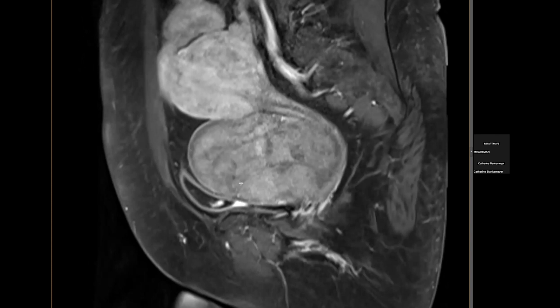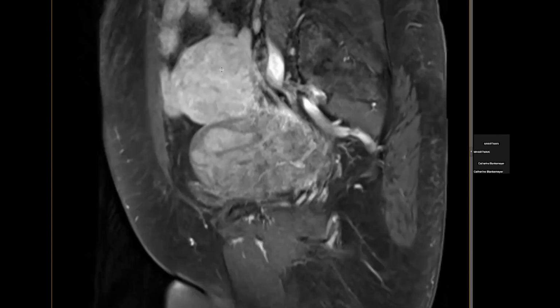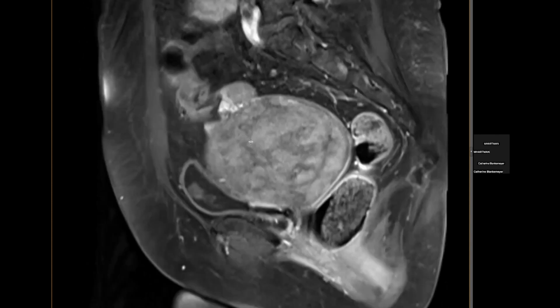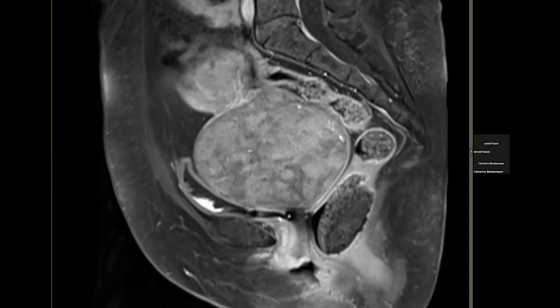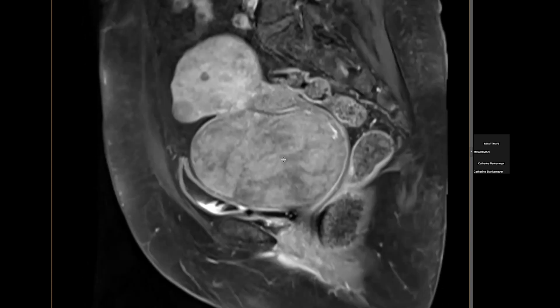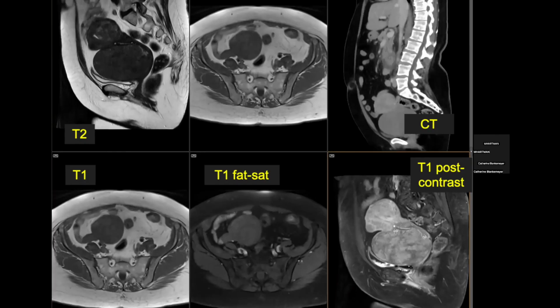But we have this part at the level of the cervix, which is enhancing almost the same degree as the uterus. We have that fibroid up there, which is enhancing similarly to the rest of the uterus. So these are going to be solid masses in the uterus, likely fibroids, and this one looks like it's coming off the level of the cervix. And we will see if we're right with Katie's gross specimen, which she was able to follow this patient from the imaging to the OR to final pathology.